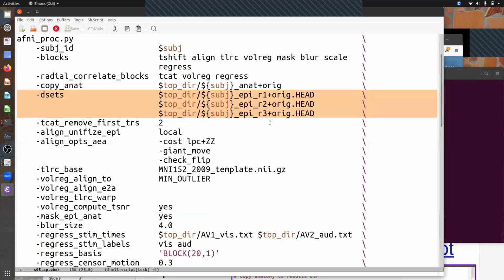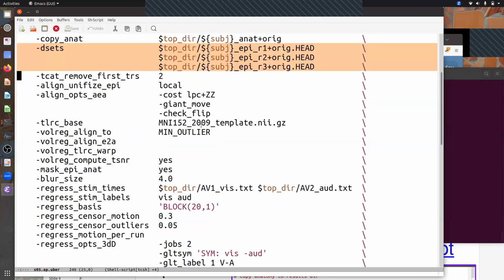In this case, this shows maybe a more realistic example of, as you get used to processing data, you want to control a lot more features about the processing, and you can do it. So we put out vanilla examples for processing, like if you're starting with task-based data, here you go. If you're starting with REST, here you go. And then you can take and tweak everything you want. That's fine.